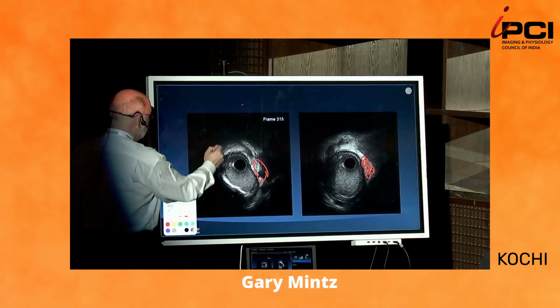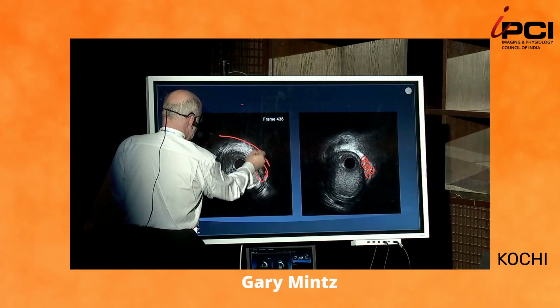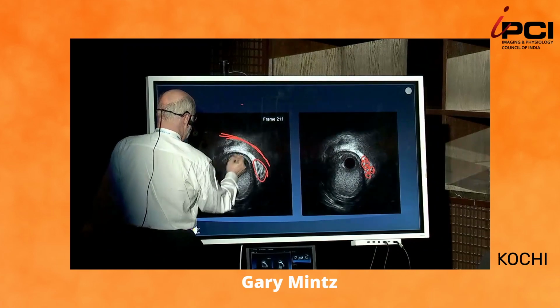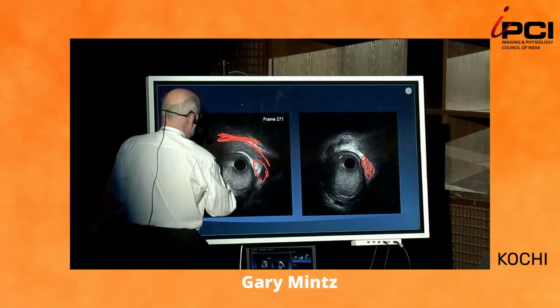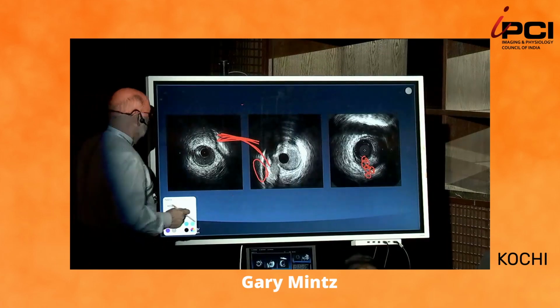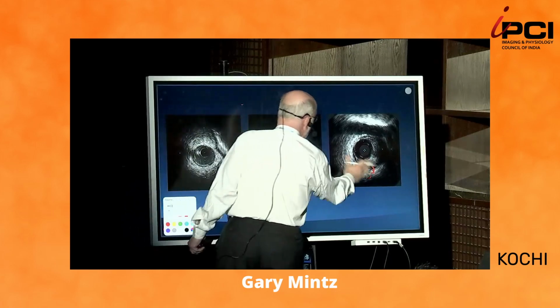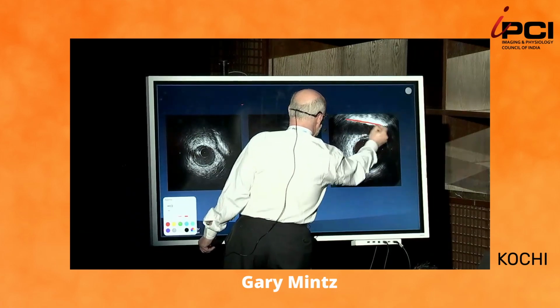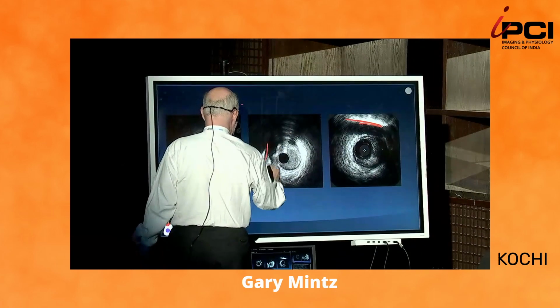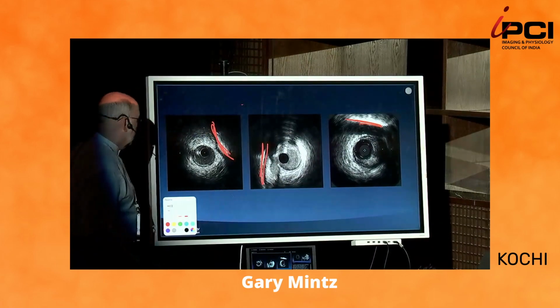And then what is this? It's coming in and out. This thing here. No, it's pericardium. Okay? And so here are several other examples of pericardium. Here, here, and here. Okay?